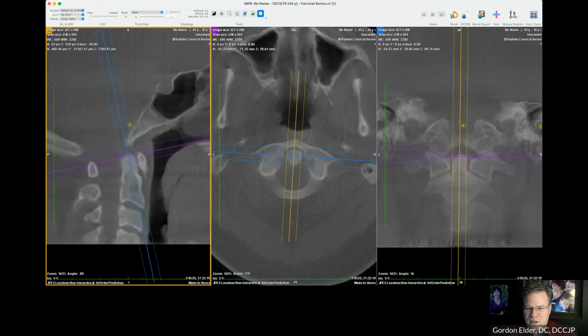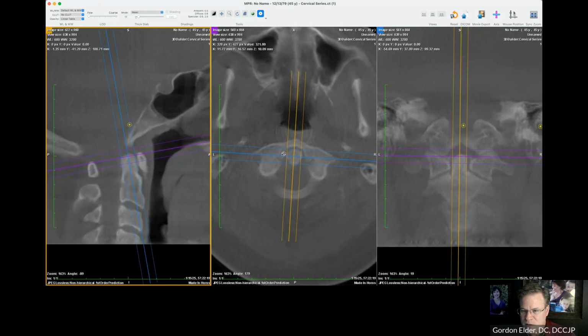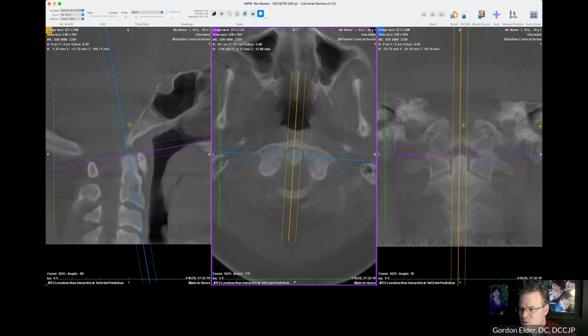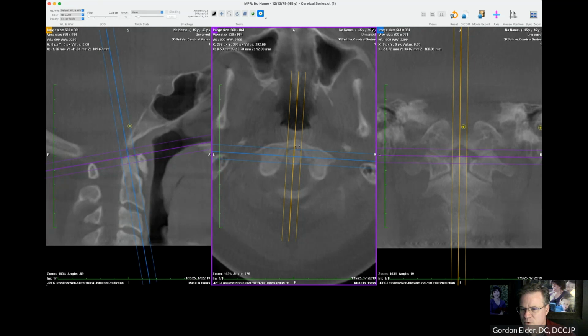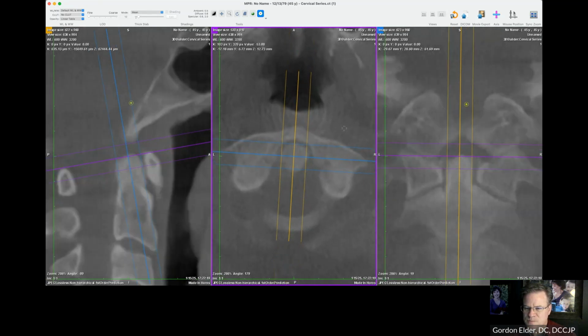And so I will need to go back to our starting point when I start taking measurements, except for this one here, because moving this up and down isn't going to change what's going on here. We'll talk a little bit more about that later. So right now, if I come up just a hair more, I'm getting both joints in there. So let's bring this in closer.